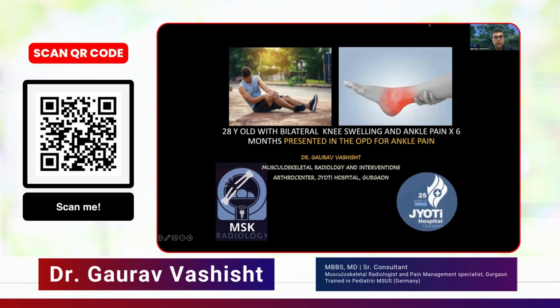Hi everyone. So today I will be discussing a case of a 28-year-old with bilateral knee swelling and ankle pain for over 6 months, and he presented to the OPD for ankle pain to get his ankle sonography done. So the idea of this case discussion is to emphasize the role of MSK ultrasounds, how important they are, and how dynamically you can identify and diagnose various disorders.